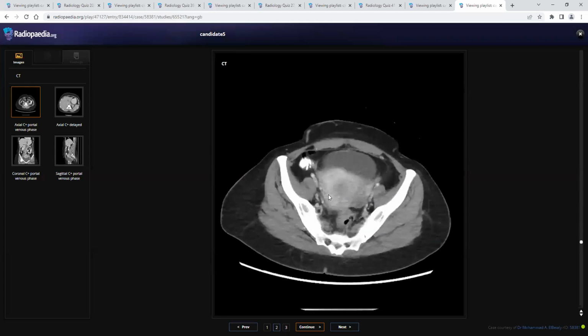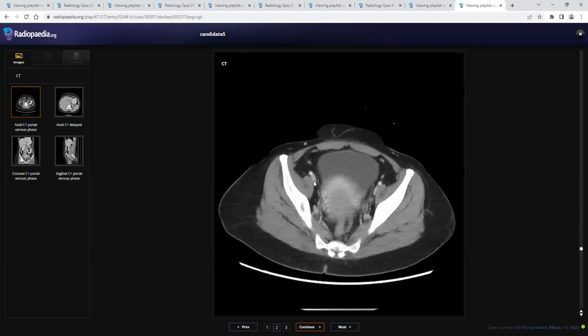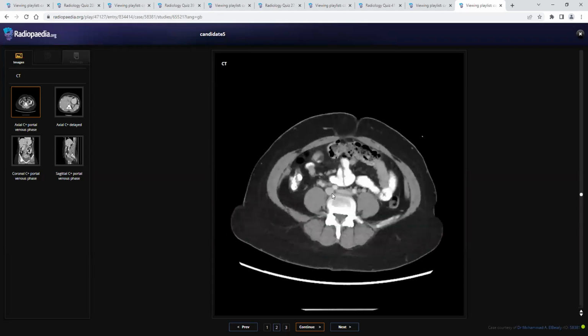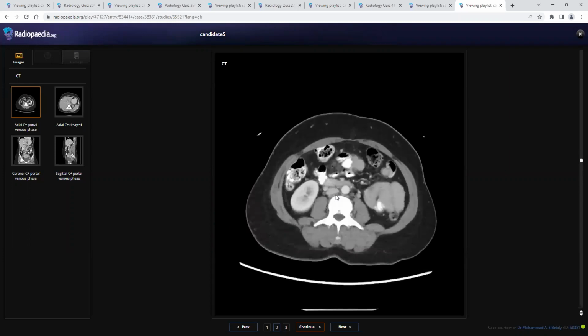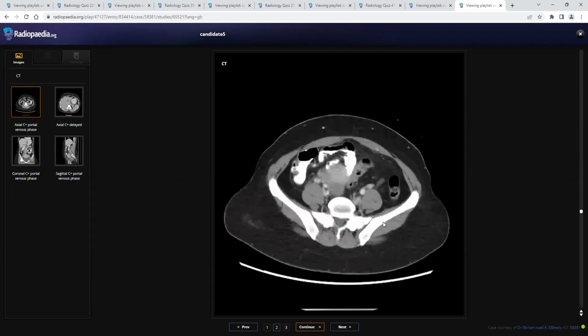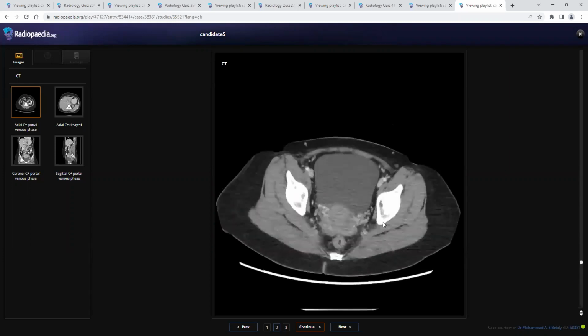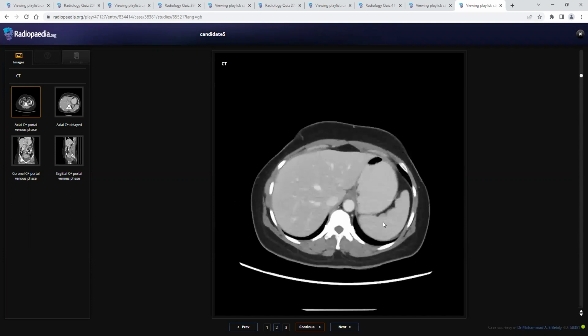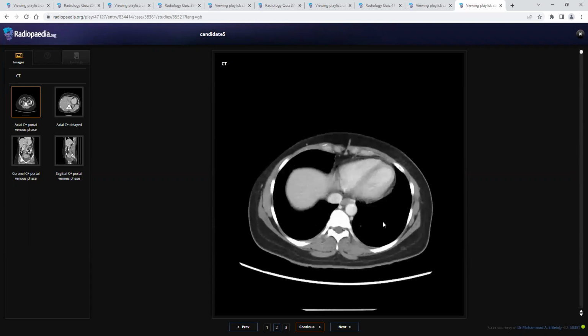Iliac veins are fine. Okay. See, this is the iliac vein, external iliac vein coming here and joining. This is the common iliac and IVC. This was my exam case, first case. Okay. You did well, Ali, all the best. Okay. Thank you. Okay, Asad.